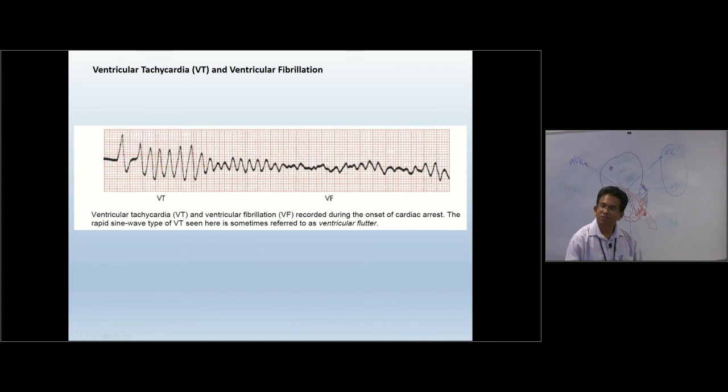All right, so this is one of the other abnormal rhythms. This is a lethal rhythm, so this patient is about to enter asystole. You have to use cardioversion or some sort of treatment to reverse this back to normal rhythm. You won't see this one in GP settings. Sometimes you might see it in EDs or in cardiology units. I think Lisa discussed this one as well. I think that's the basic interpretation lecture.